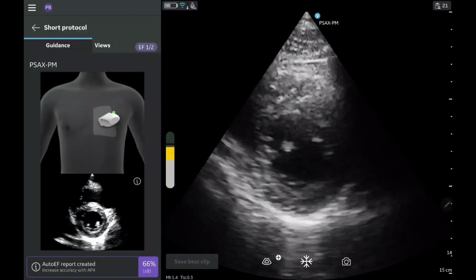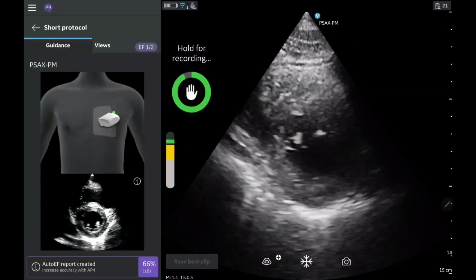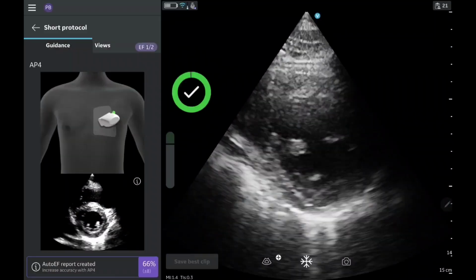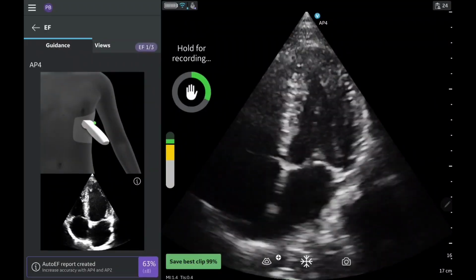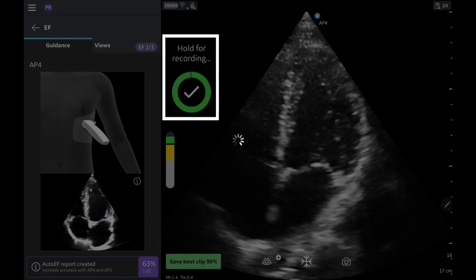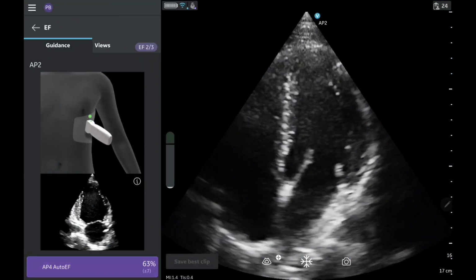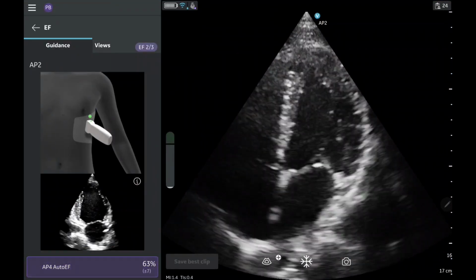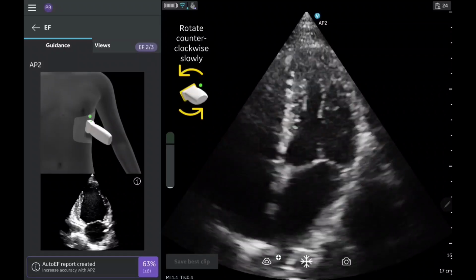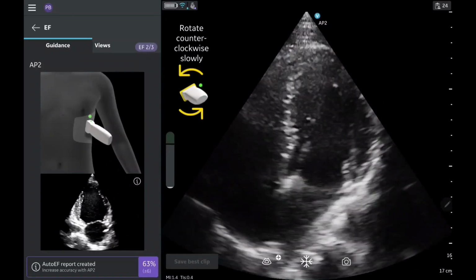The software can capture up to a 4-second clip if you are able to hold the quality meter above threshold for that length of time. If an image is captured with AutoCapture, a checkmark inside a green circle will appear. If sound is enabled, you will also hear a ding. In addition, you will see a blue box move across the screen from the bottom left corner to the top right to your image gallery. This indicates that the image has been successfully captured.